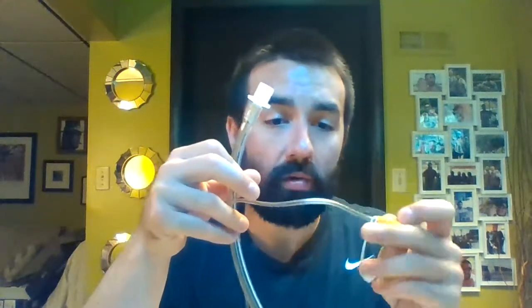And then every 4 hours, or when you're going in to see your patient, we should take a 10 cc syringe, take the suction tubing off, and do an air bolus only, never add liquid down there. Okay, and that just makes sure that nothing's getting gunked up and this line is staying unobstructed. Keep in mind that anybody that is going to be on a ventilator for a prolonged period of time, or you think they are, we should try and use a high-low suction or subglottic suction ET tube, because it's going to decrease the risk for ventilator-associated pneumonia. By decreasing the oral secretions pooling on top of that cuff, we can hopefully decrease their incidence of VAP.